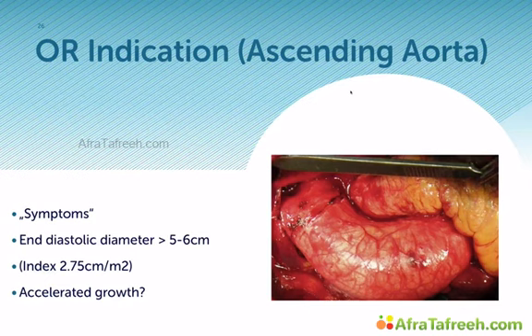And another thing to look at is how quickly the aorta actually expands. One thing one should always do is to monitor these patients very closely, especially at the beginning, and then you can increase the intervals, and in between also perform CT scans, because the CT scan has its advantage, especially in visualizing portions of the aorta which you cannot see with transthoracic echo.